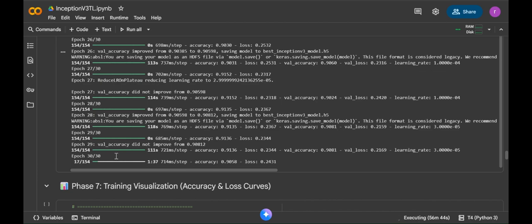more accurately. Our main goal in this project is to automatically classify brain MRI images into 4 categories: glioma, meningioma, pituitary tumor, and no tumor, using deep learning models. By doing so, we aim to help doctors make quicker and more reliable decisions based on AI-generated insights.